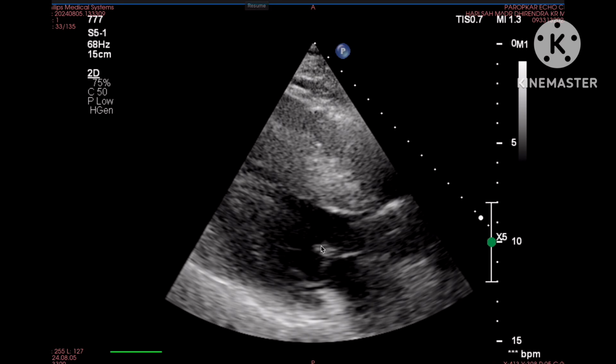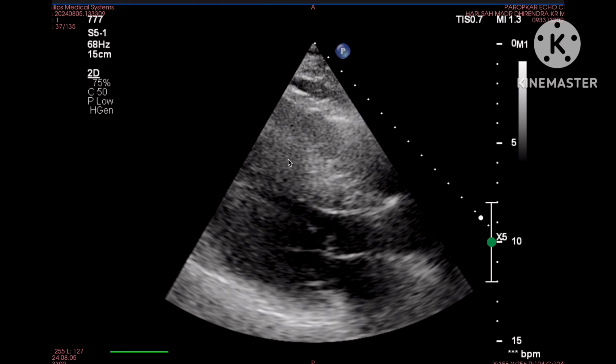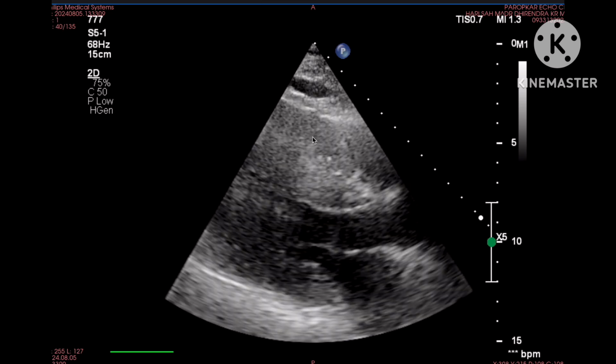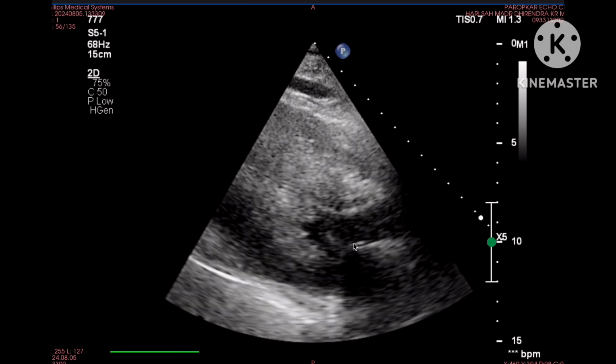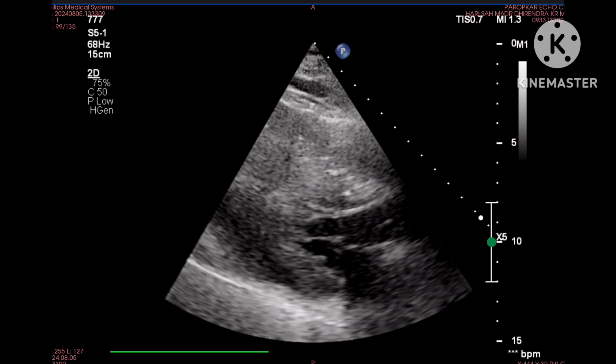This closed mitral valve, if you just move a little bit, you see how it happens. See, this portion has moved towards the interventricular septum. Again, it moves almost here. So very minimal space remains in the subaortic zone to pass through, and that is causing subaortic dynamic flow obstruction in case of HOCM. So this is the case of HOCM, and there is SAM and significant subaortic flow obstruction.